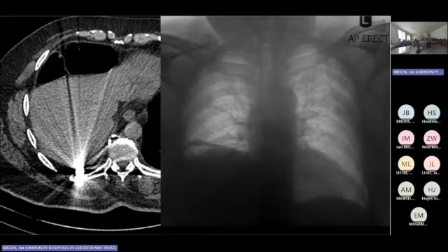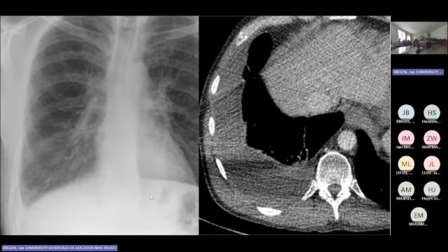Yeah, you can spend a long time. What is that? What happened? Just look on the chest X-ray, and it's there. Presence of pleural effusion. So sometimes X-rays, in particular AP projection, supine, semi-erect, could be tricky. From the X-ray we can tell there is some effusion, but probably not much. With the CT, there's much more.